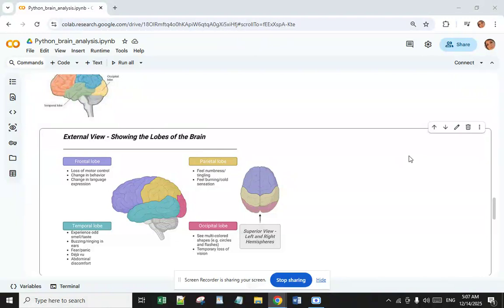The next one is deriving spatial maps from group functional MRI data using ICA and dictionary learning. Derive spatial maps or networks from group functional MRI data using two popular decomposition methods, ICA and dictionary learning, on data of children and young adults watching movies.